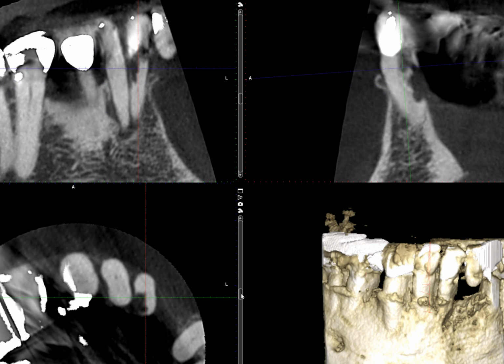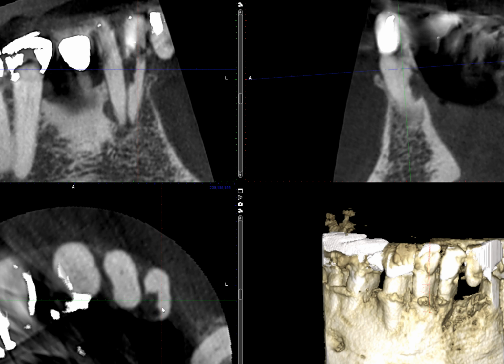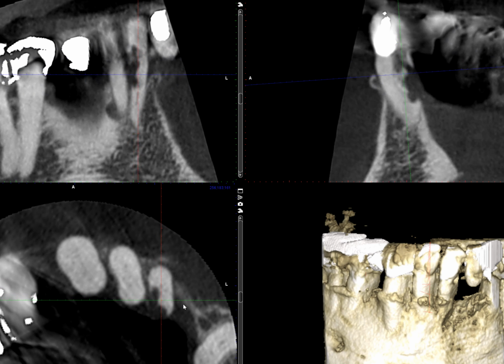I think what's fairly clear here is that, at least from a radiographic perspective, this resorption does extend into the canal or pulpal space rather than this enlarging from the pulpal space. So I would say that this is an example of external resorption. Or you can say cervical resorption as well, as it may have started from the cervical region and extended inferiorly.